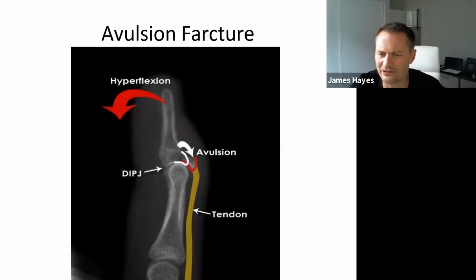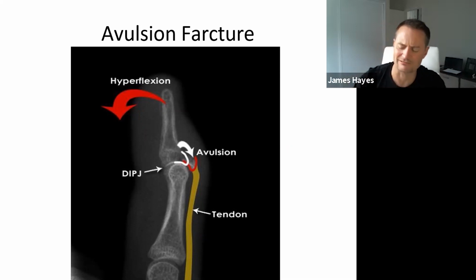An avulsion fracture is seen in something this country absolutely loves, netball. Okay, balls landing on the tips of the fingers and pulling them back a bit, little avulsion fractures here. And in the feet, okay, from the stop-start motion of netball. Dangerous sport. My daughter won't be playing that.